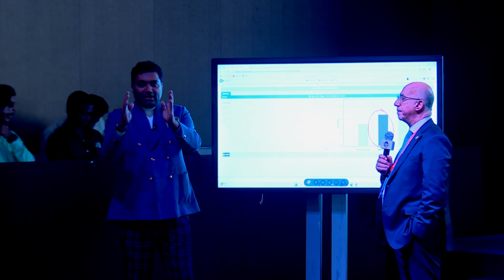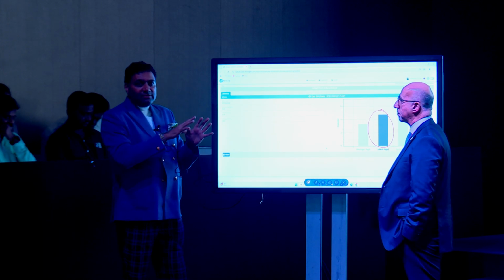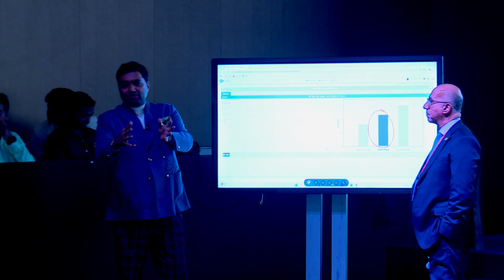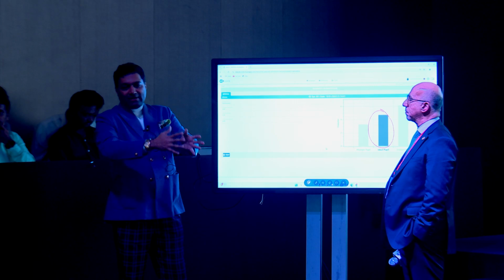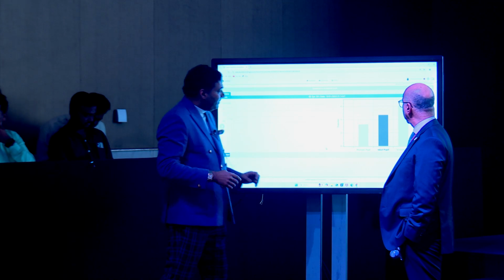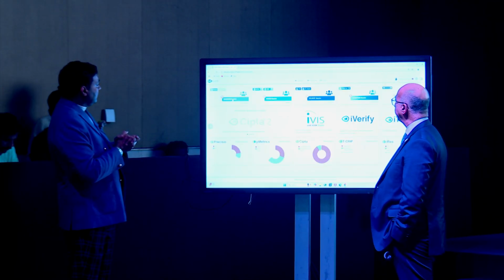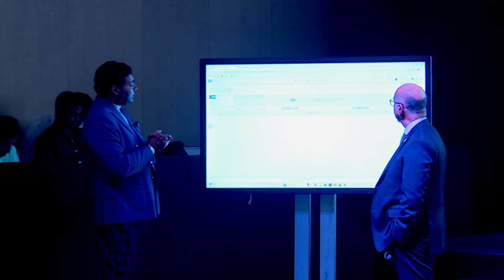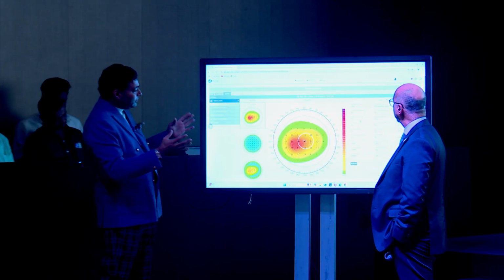Now, the pupillometry data is fed into the machine. And then comes a software platform where you add the pupillometry and all the ray tracing platforms you've done, which includes the entire platforms of epithelium, your stroma, your posterior cornea, and then it goes to the planning software. And now, this is the planning software.